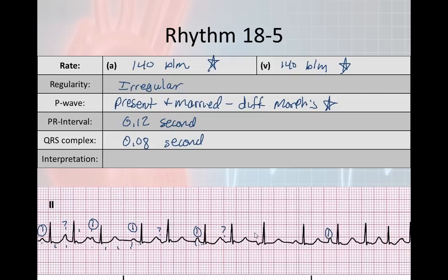So let's go ahead and look at this one. Let's look at this as being a 2. We don't have any more that look like that right there. So this one might be a 3 right here because it's completely different, which would actually make this a 3. So let's go ahead and change this to a 3. And this one here looks like a 3 because those two here definitely look different than this one right here. So I'm going to call that a different one right here. This might be a 3 right here, but it's kind of hard to tell. There's a buried one in here. Know what that is? No idea what that is.